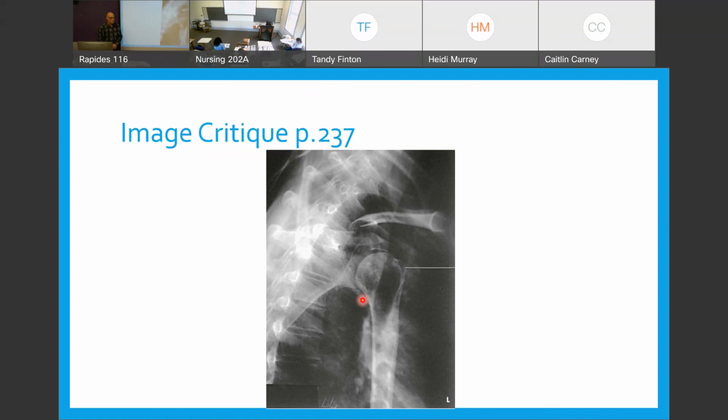You sure? Don't just say gotcha just to get me on moving on, because I won't. Do you see a transthoracic now? Do you see a lateral chest x-ray, the top part of a lateral chest x-ray? See the black lung fields? All this is lung, right? And this is the humeral head. Remember what I told you to do. Crosshair, it hits right there. So you have to think about that. What hits at the surgical neck? That's the only one that hits at the surgical neck of the affected arm.